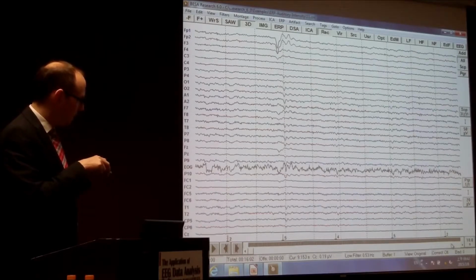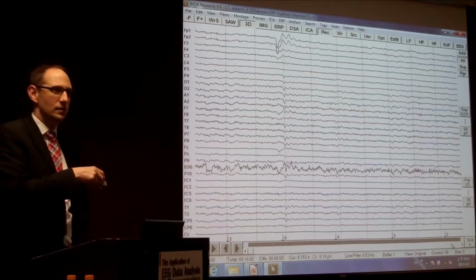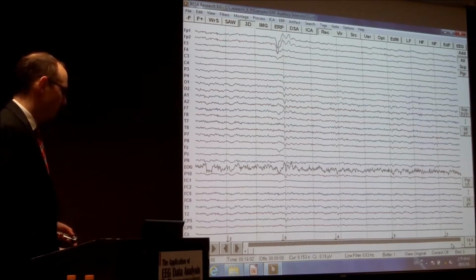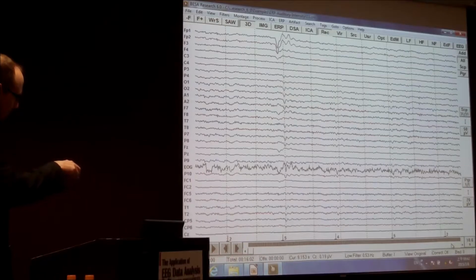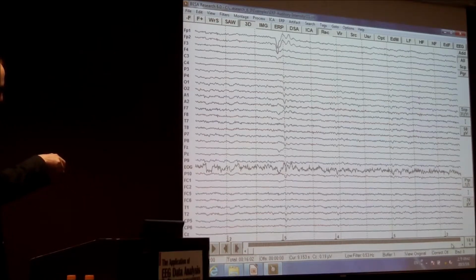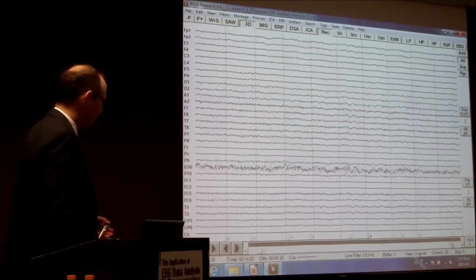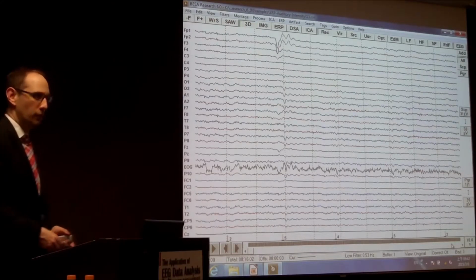So now, in fact, you see there are a lot of triggers. And it's difficult to navigate these triggers here. So by just paging through, it's easier. Okay, this brings it exactly here. This button means a complete page back, complete page forward, half page back, half page forward. You certainly can go by pressing spacebar, and certainly by backspace going back, which is just the normal way of reviewing data.